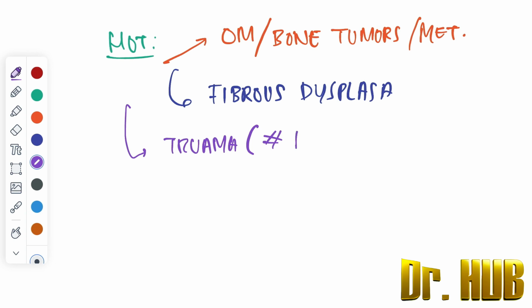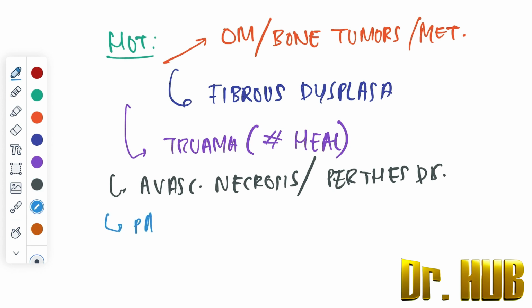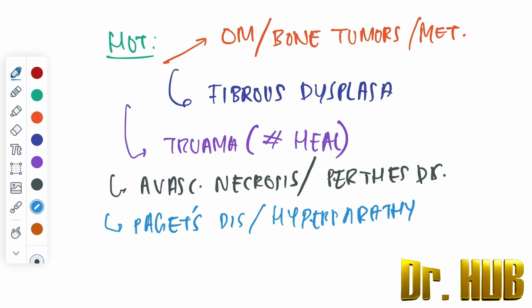Trauma is nothing but fracture healing. Then there is avascular necrosis. There is also Paget's disease, and also hyperparathyroidism.